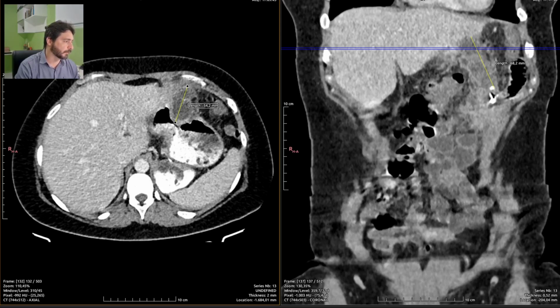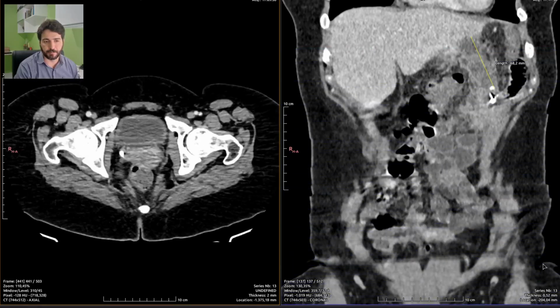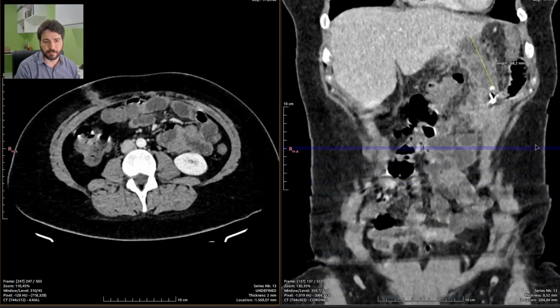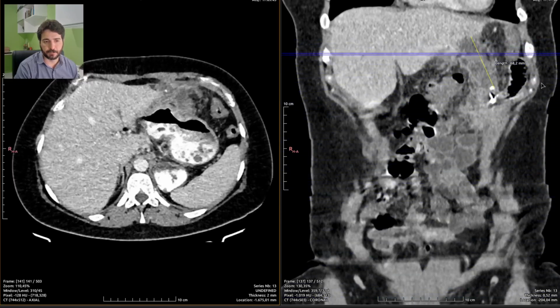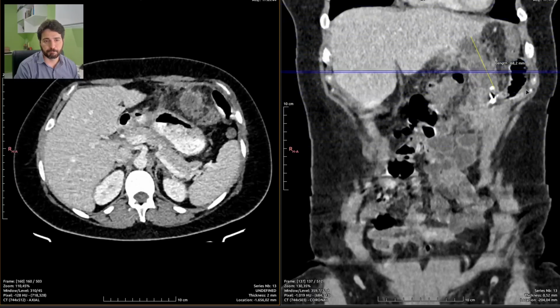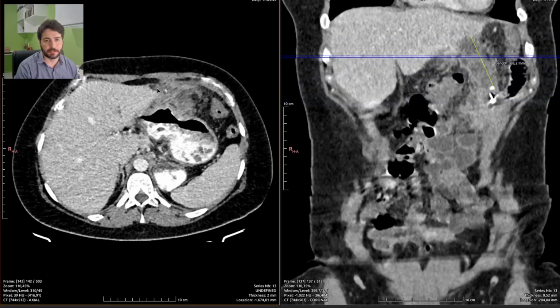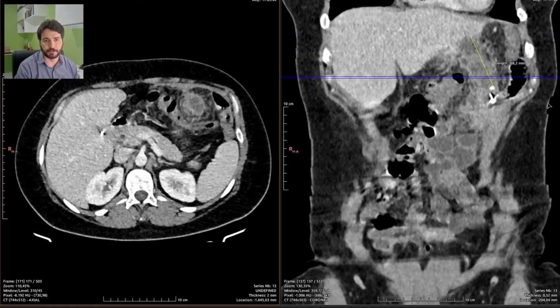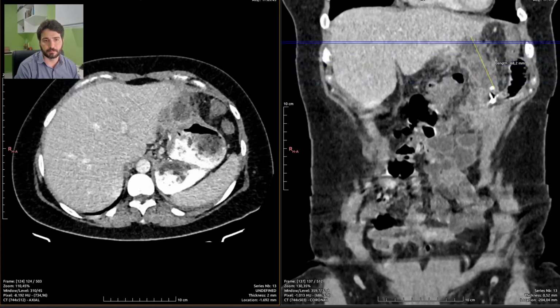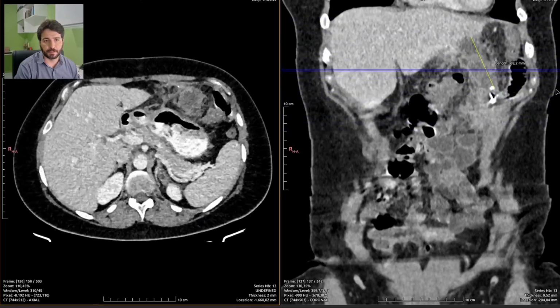So abdominal surgery isn't a stroll in the park. It is a very, very serious matter. So bad things do happen sometimes. Yep, just see that there is diffuse densification of the greater omentum next to the collection.